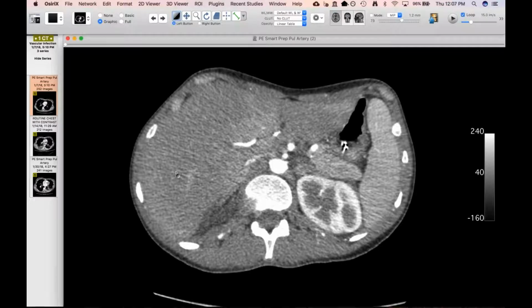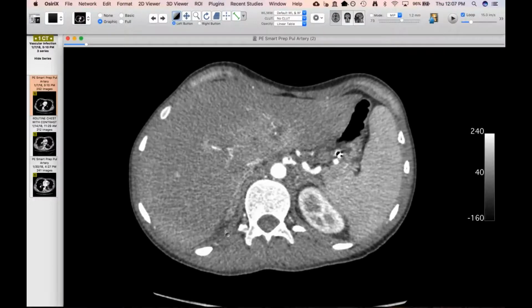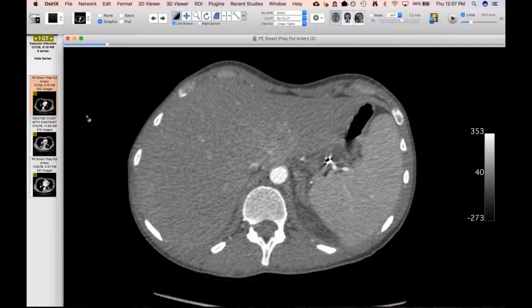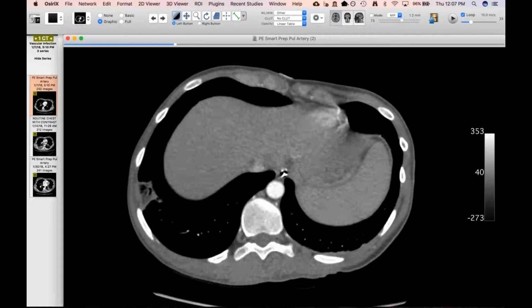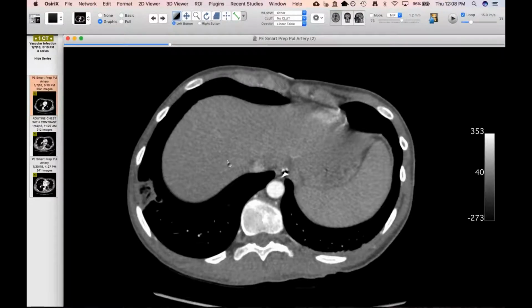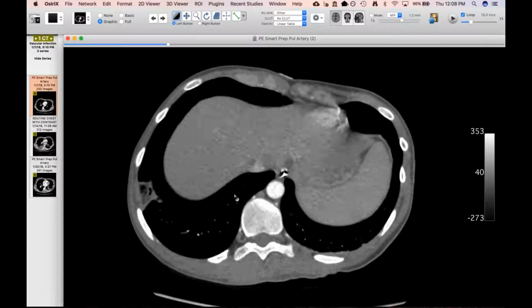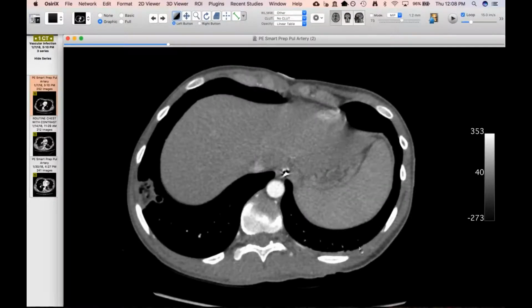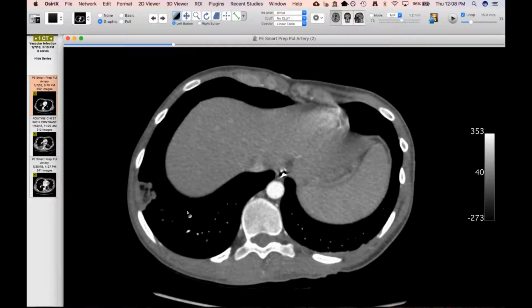Okay. Sure. This is one where I've got a mix of bread and butter stuff and some other curiosities. This one is more bread and butter, but I don't think we often see the evolution of a case like this. This is a lady in her 30s. She's a drug user, came in with fever. Actually had an abdomen and pelvis CT first because she had flank pain and ended up with what I think was a septic. Well, she had an infarct in her spleen, which you will see shortly what that's from.